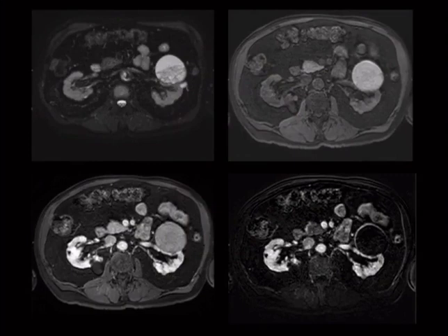All right, starting out with a gamesmanship style question. This is a very important strategy here. This is the multiple MRI sequences. See, here's how I handle these. This is my suggested strategy.